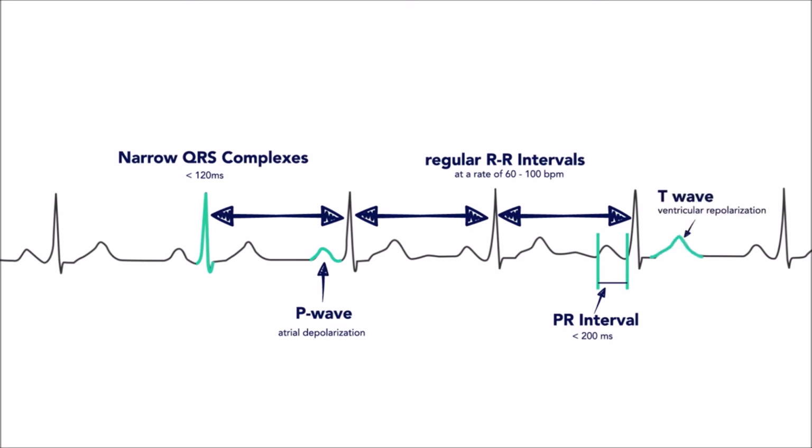This interval to repolarization should fall between 400 to 440 milliseconds after the initiation of the QRS complex. This is called the QT interval.